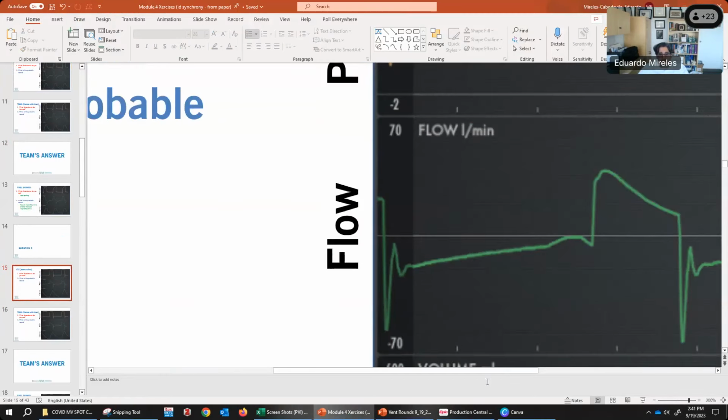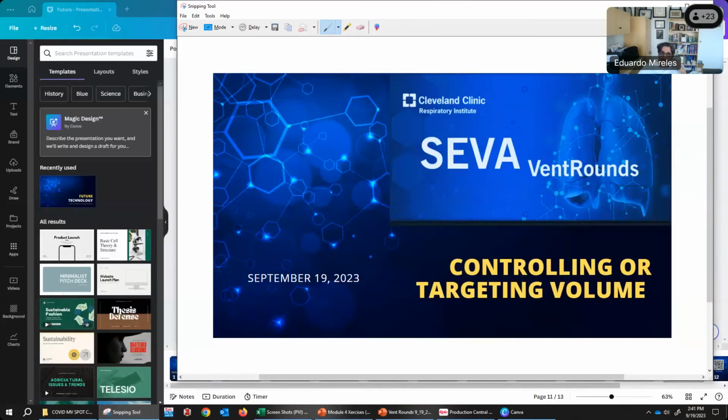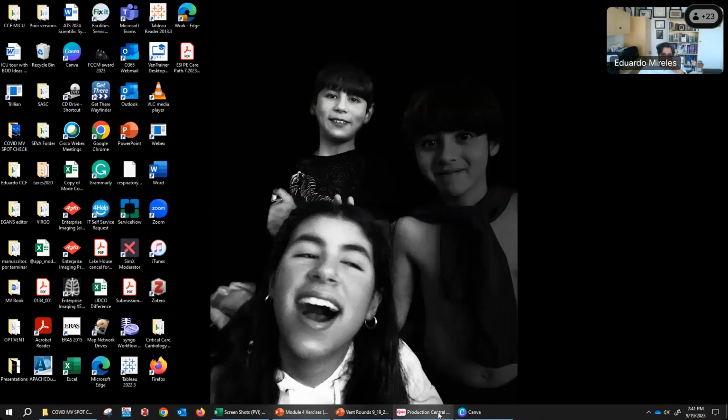So you can see here that there are several efforts occurring, and one of them occurs during the breath. So this is a failed trigger, and this looks like a reverse trigger, but it's not a reverse trigger. I hope that helps you figure it out. So it's definitely a failed trigger, which is an asynchrony, Ariel. That's the definition. Alrighty, Rob, any final comments?